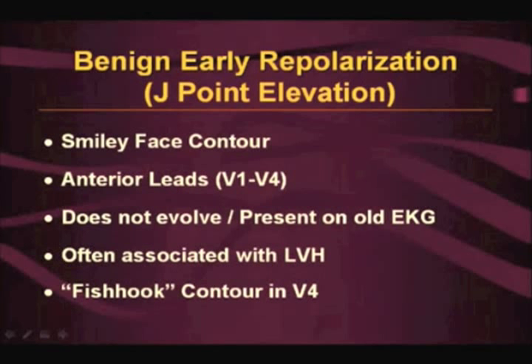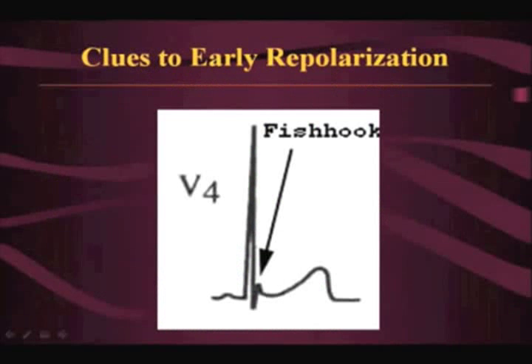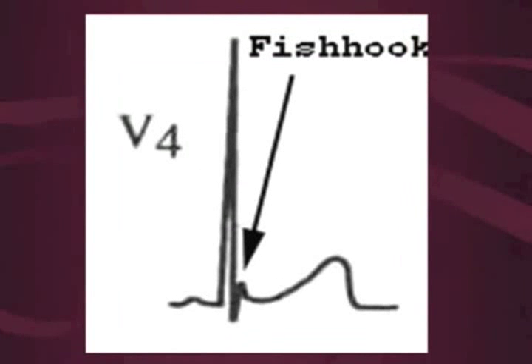Who's heard of fishhook in V4? Nobody? So 1, 2. Fishhook in V4 is a very important concept. So this is, does anyone fish here? Okay, so does this look like a fishhook right here? Okay, there you have it.